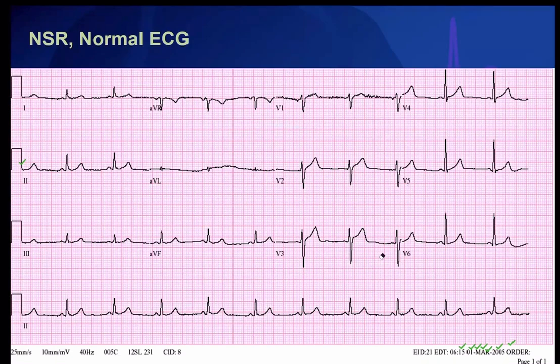On the same ECG, I can give you a quick 10 Chamberlain rules of how to read an ECG. The Chamberlain rules, which we are going to describe, are actually speaking about lead 1 and lead 2. Lead 1 and lead 2 are pointing upwards, as you can see on the arrows I am putting on them.